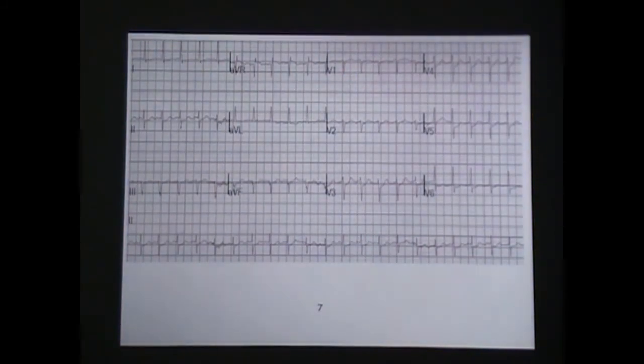Now, I see ischemia over here that we're talking about. I don't see any reciprocal changes. Maybe I need to jump on, do I have a tall QRS? Yeah, it's kind of tall. Do I have S waves here? I do have S waves here. So is this a left ventricular strain pattern? Typically you see it in V5, V6, but again, textbooks and real life can be different.